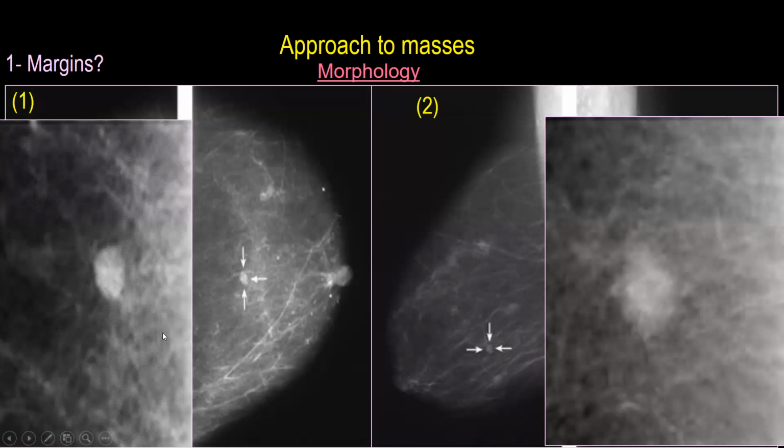Now look, in spite of spot magnification, the density appears brighter, even more dense. So these are small but dense. And regarding the margin, can you see the margin? Is it as you have seen it here? No, indistinct.